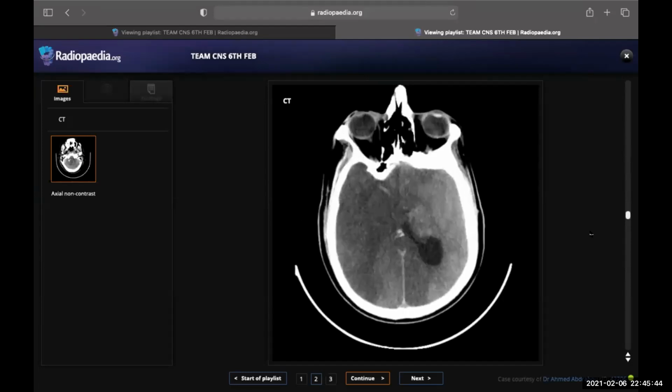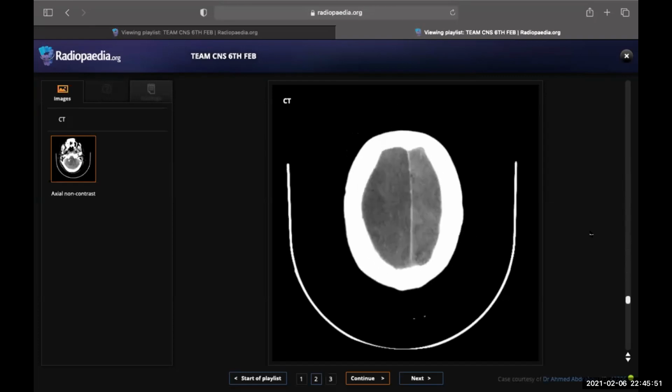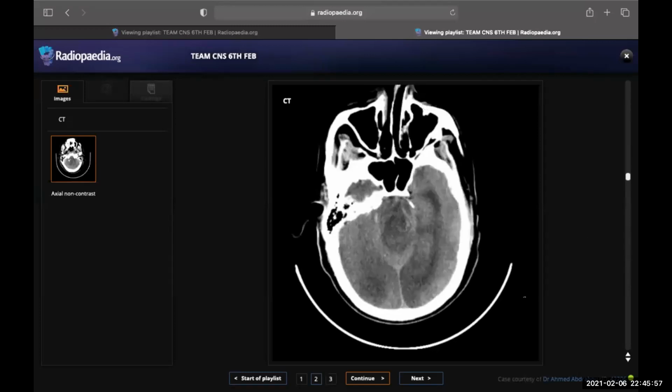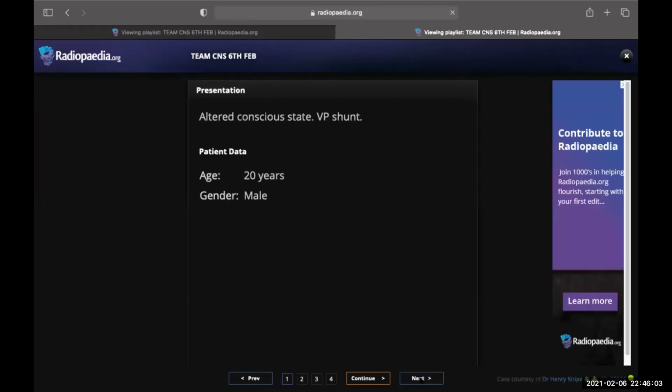Okay, this infarction is where? Which territory? Mainly MCA and ACA also. There is some, mainly MCA. Okay, we'll come back to it. Well done. Okay. Your next case.